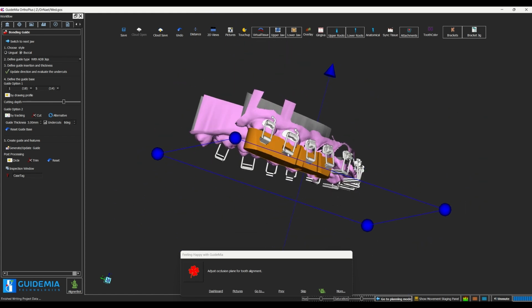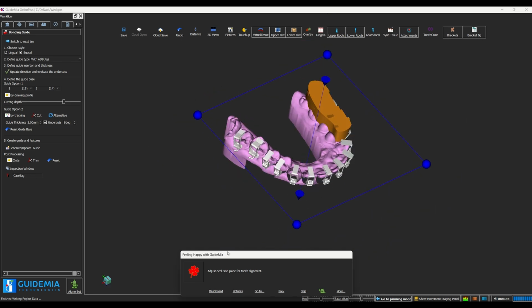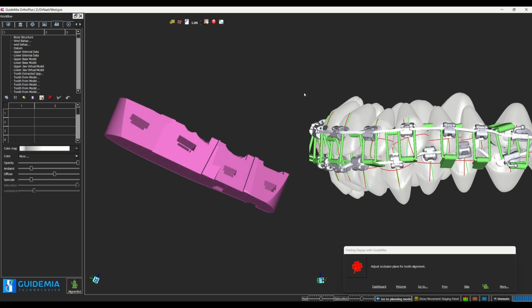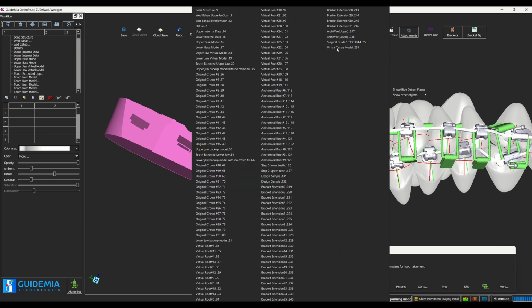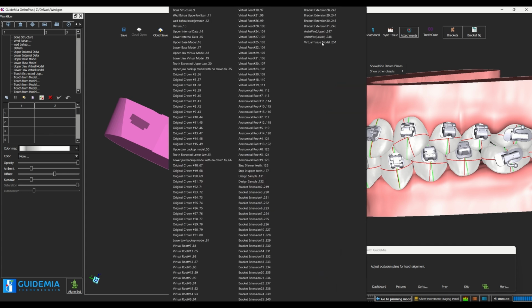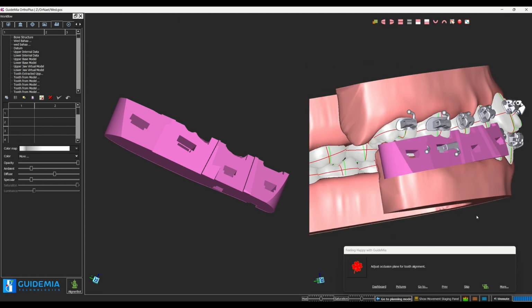If we really have a physical model of these inserts, we can insert them into the guide. You see a slight difference because the guide is in the initial position of the model. So if we go back to here to review the models, that's how the guide looks. If we right click here, we can show the guide on this model too. That's a virtual tissue model. The guide is showing up here.